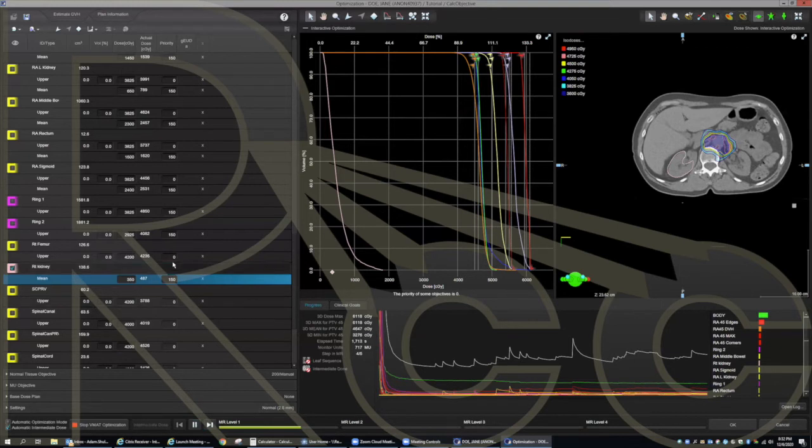So I'm just going to continue on. My organs at risk are close. I think you get the idea of how to optimize on each step. I could honestly keep doing that, slightly pushing them all the way up to the end of step 2. That's the idea. Each interval I would pause, slightly move each organ at risk until the end of step 2.